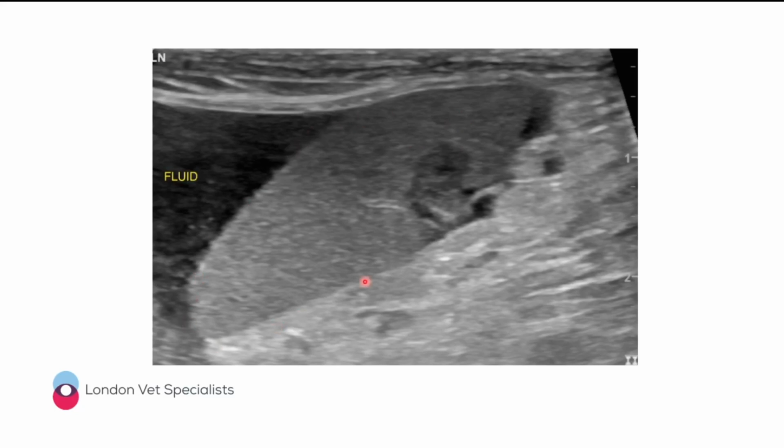However, I'd like you guys to just try and ignore the spleen here, and concentrate on the fact that there's a moderate volume peritoneal effusion, but more on the appearance of the mesenteric fat in the far field relative to the spleen. So this fat is thick and it's bright. So we've got evidence of a peritonitis here, which is associated with this moderate volume peritoneal effusion. So for peritonitis, we're looking for thick, hyperechoic mesenteric fat, and more often than not, if you guys have picked up peritoneal effusion, even if it's a small volume peritoneal effusion, then there will be an associated peritonitis.